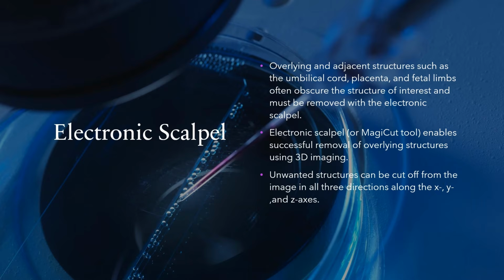The electronic scalpel is particularly valuable in imaging areas such as the fetal face, brain, heart, and limbs, where surrounding tissues often obstruct the view. By removing these obstructions, it is easier to obtain detailed, accurate images, enhancing both diagnostic accuracy and clinical decision-making.